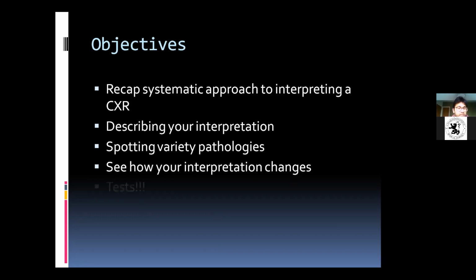Finally, there'll be some tests. At the very end, there'll be a lot of X-rays that we'll go through. I'm going to give you a couple of minutes on each slide to spot the really quick, obvious abnormality that you see in it.